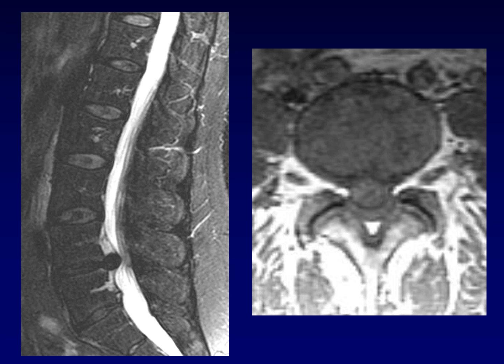We'll show a couple examples of pathology in the spine. This is an MRI of the lumbar spine. This is a T2-weighted image in a sagittal plane. Remember on the normal images how we talked about how nice and smooth the posterior longitudinal ligament was going to be as it came down behind the vertebral bodies and discs?